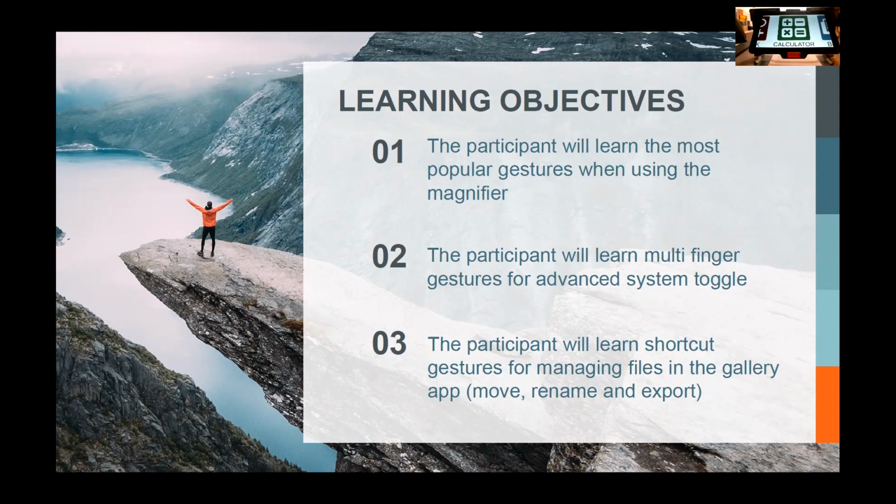Very nice shortcuts. Also, when the distance camera is connected to your Connect 12, you can swap between the magnifier and the distance application by swiping your finger horizontally from left to right and back. Because my screen just went to sleep, let me wake it so that you can see something at least while somebody's talking to you. There we go. All right, so that was the magnifier application.